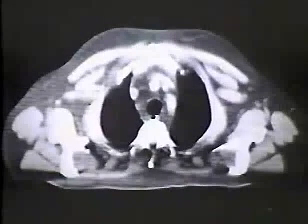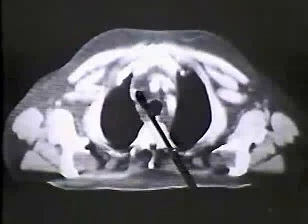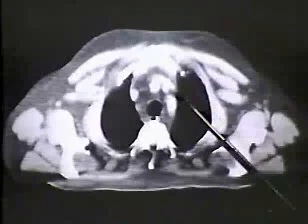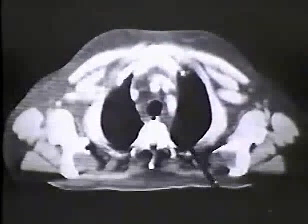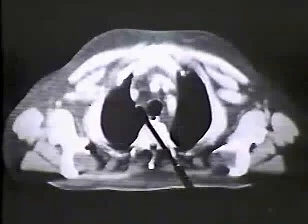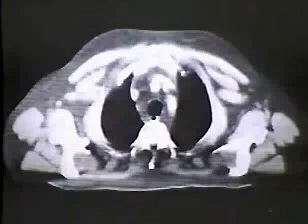There are the 2 veins to be accounted for. On the right, we see the brachiocephalic vein with perhaps a small tributary feeding into it, and running across in front of the great vessels is the shadow of the left brachiocephalic vein. Again, notice there's an abundant amount of fat, and notice that the separation of the right lung from the trachea is greater as we proceed toward the neck. Therefore, the tracheal wall stripe may appear thicker as you proceed in this direction.